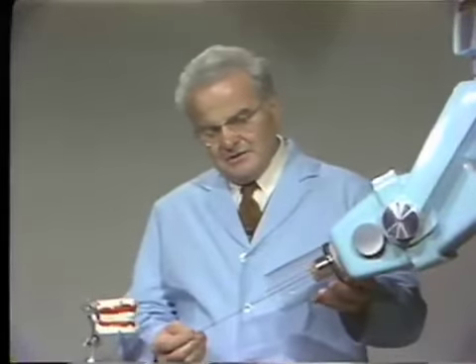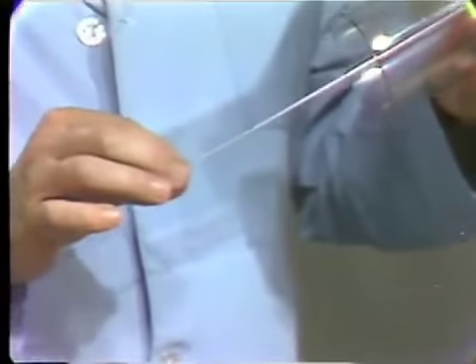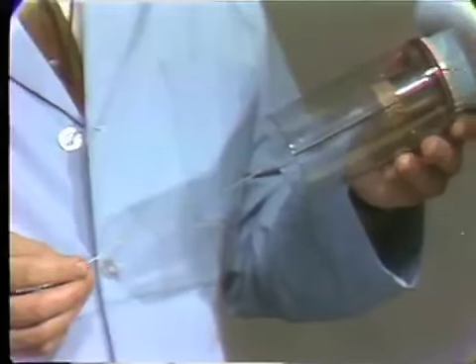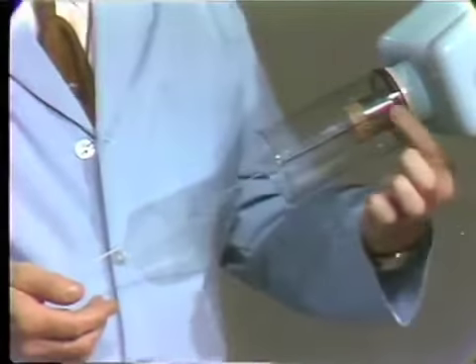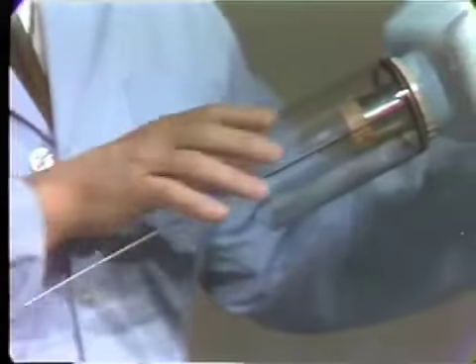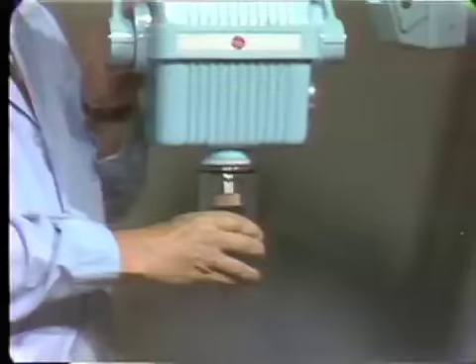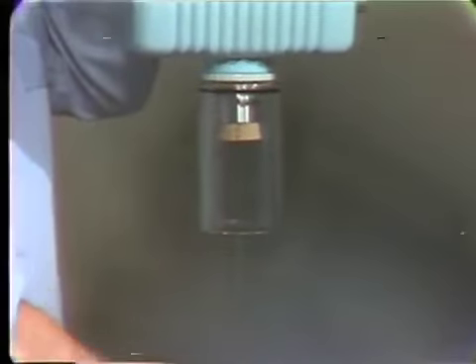Now, I have inserted in this open-ended cone a slender wire. This is to illustrate the central ray of the X-ray beam. This is purely a hypothetical sort of a thing. On the side of the cone, you see a dark line, and it is also indicating the path of the central ray. Now, if I turn the apparatus down so that you're looking at the black line at the top of the apparatus, you see it too is pointing the path of the central ray.